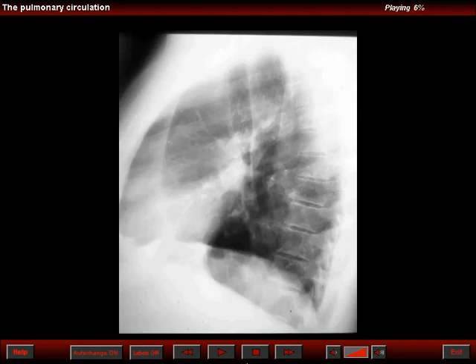The lateral view of the chest shows typical signs of collapse of the left upper lobe. Note the hyperexpanded left lower lobe. The curvilinear density that crosses the heart, ventral to it, represents the collapsed left upper lobe. So the paucity of the pulmonary vasculature was due to the hyperinflation of the remaining left lower lobe.